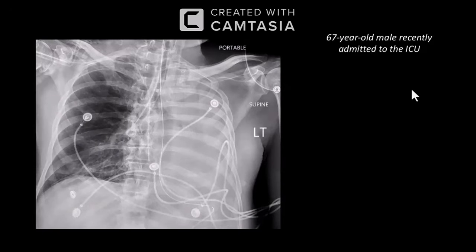Yes, and on the contralateral side, the right lung is well aerated. In fact, I can appreciate that part of the upper lobe is crossing the midline. There is no effusion. The right hemidiaphragm is clearly noted, while the left hemidiaphragm is obscured. Looking at the bones, they appear normal with some degenerative changes in the right glenohumeral joint.